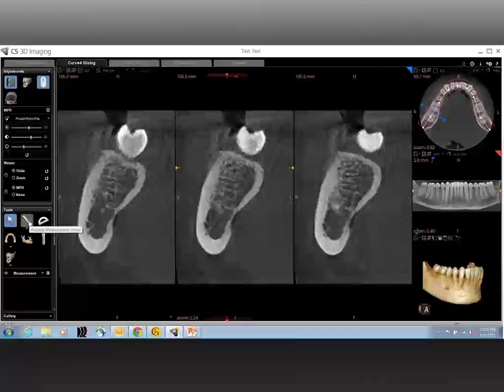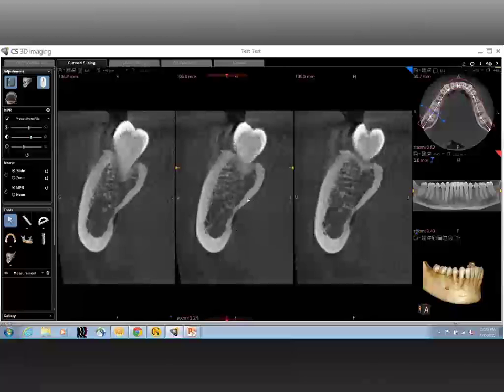Now, beyond that, you also have to look at the lingual undercut. Every human being, all of us, do have some sort of lingual undercut to some degree. Is it a very critical finding? Probably not. But in terms of implants, it is important to note, as you notice, that there's a slight thinning of the cortical bone there.